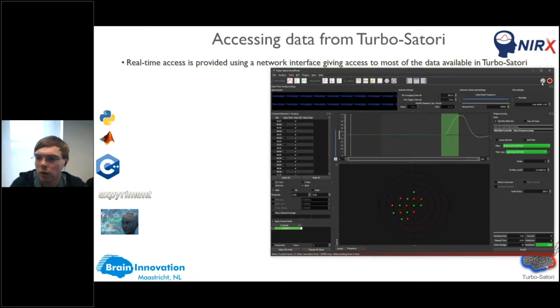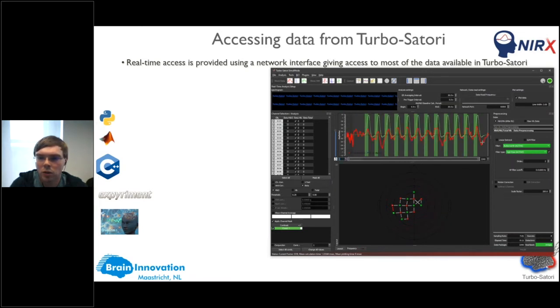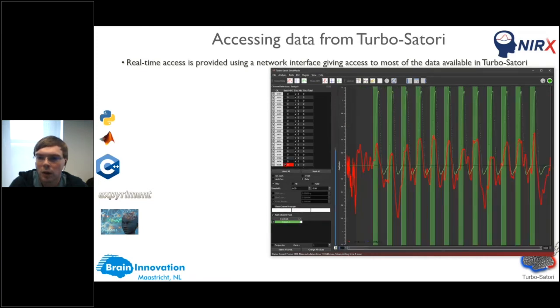You can switch to fast mode by turning this wheel to the maximum, and then the data will be read as soon as possible. Now we select a channel which we already know gives some promising data, and check that all the data is available, which you can see now quite nicely.